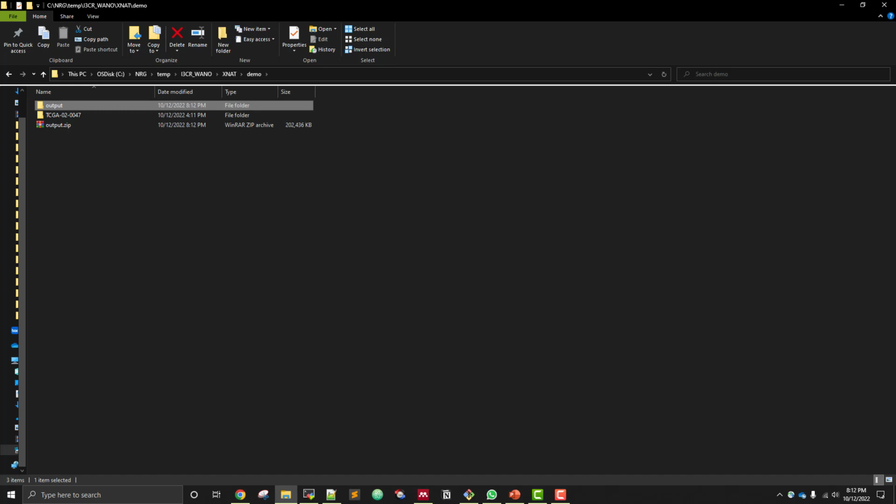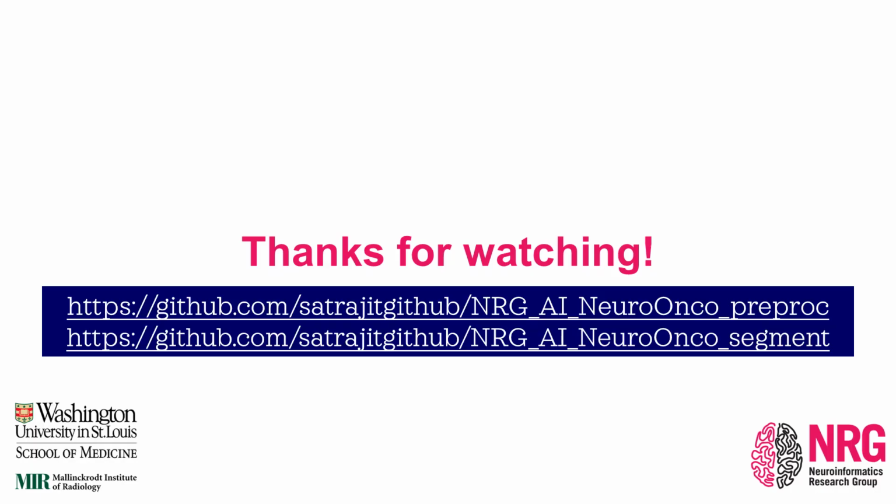So if you want the details of these different outputs that I produced, I have discussed that in my other video where I show the usage of I3CR-WANO using Docker. You can check out that video to see the different output details. So with that, I would like to end the video.